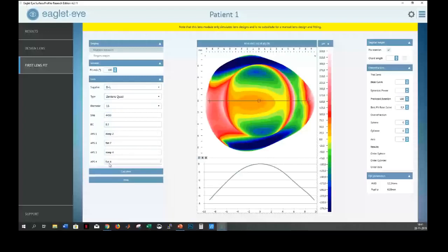We offer something more, and this is the over refraction tool, which we show on the right side. And the prediction of the algorithm was use a sagittal height of 4,450 for your final lens.